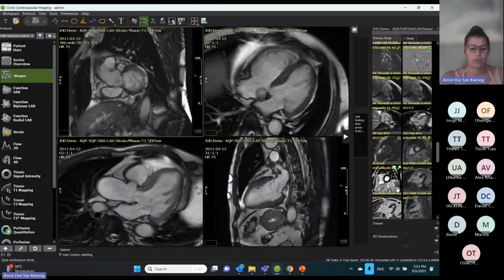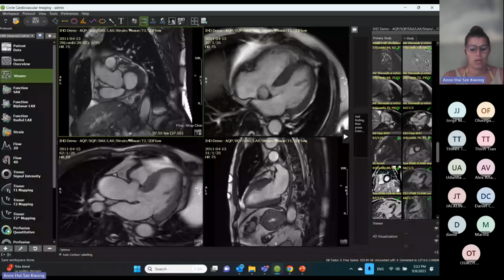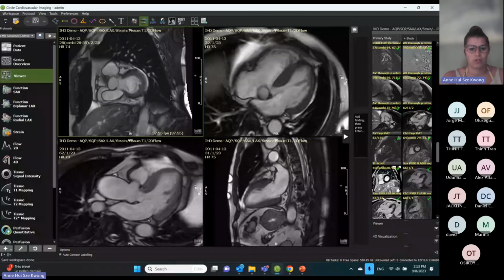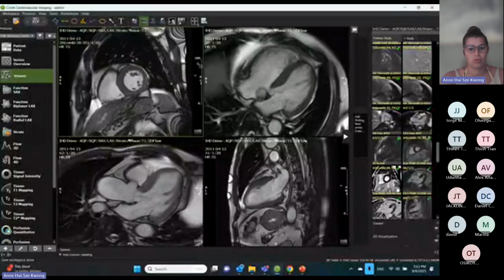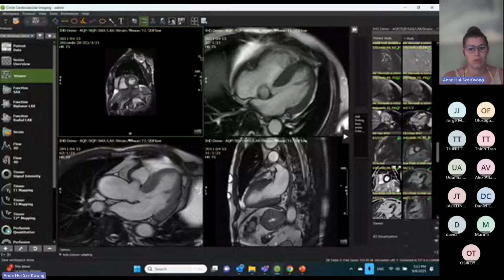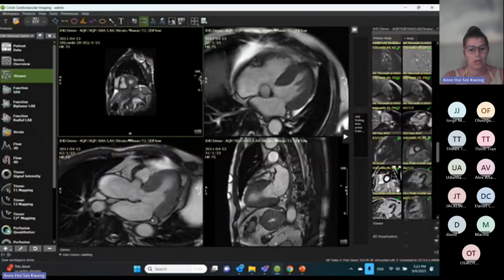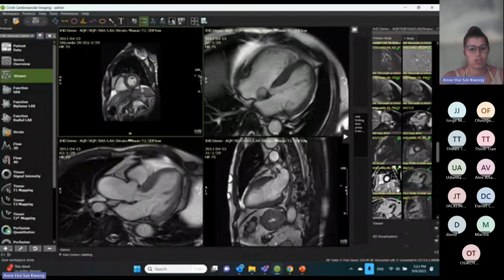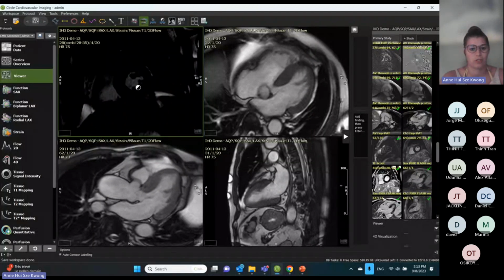If I want, I can run the cine with the space bar, or I have the play and stop button here. I can also go over the different slices with the scroll of my mouse. I can choose to zoom a bit with this big cross. I can see it when I'm going on the right side of the image. I can also change the contrast of the image if I push the scroll of my mouse and drag it.